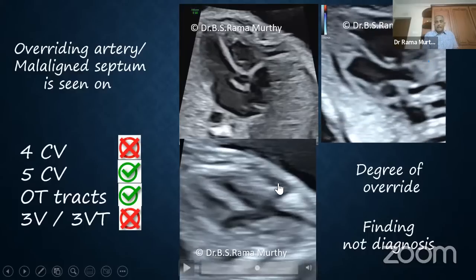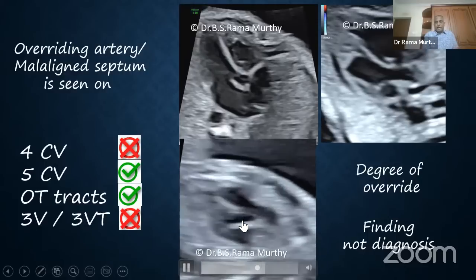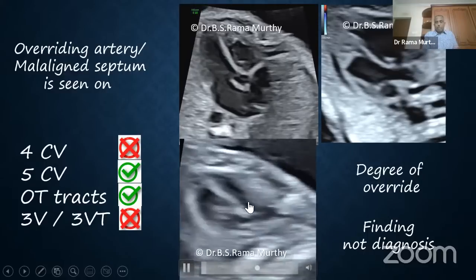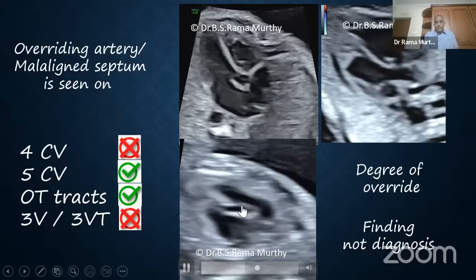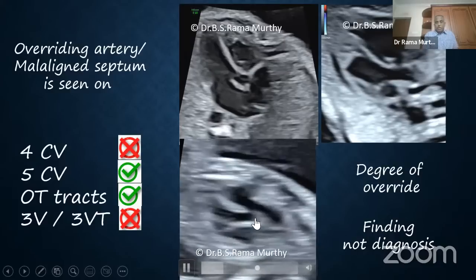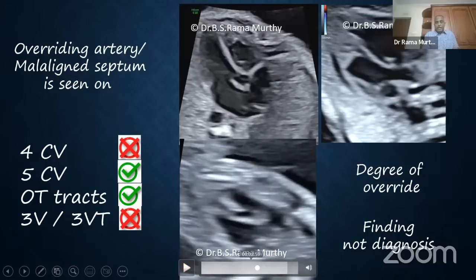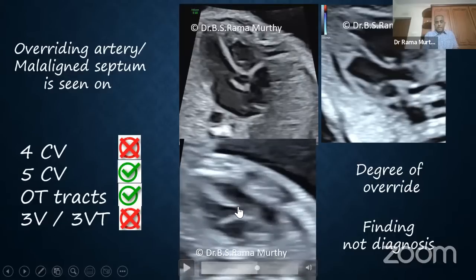On the other hand, let us look at this clip. And here you will see that the aorta has overridden the septum, the crest of the septum is here. This is the aortic root, and the aorta is clearly overriding the malaligned VSD, and therefore both the right ventricle and the left ventricle are pumping blood into the aorta.